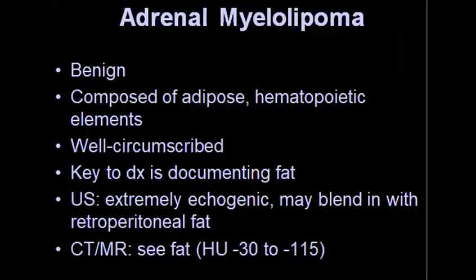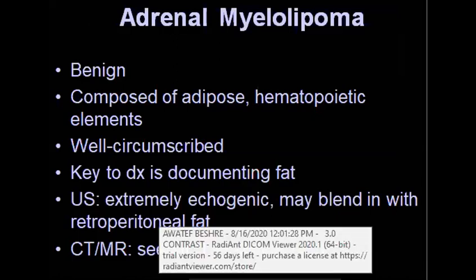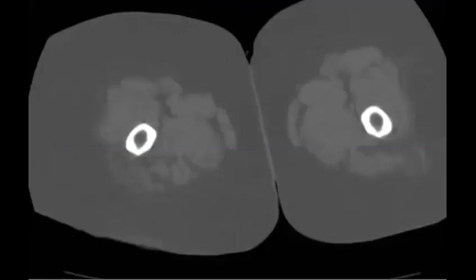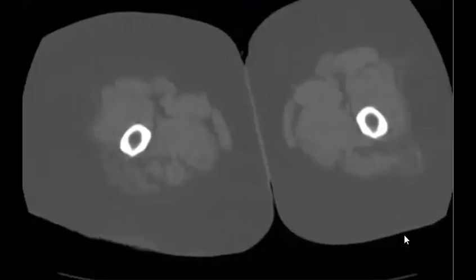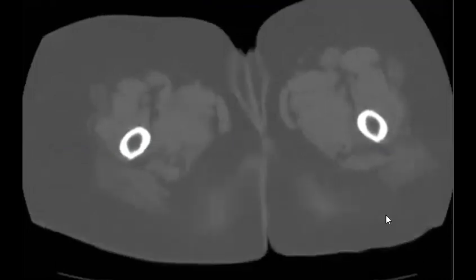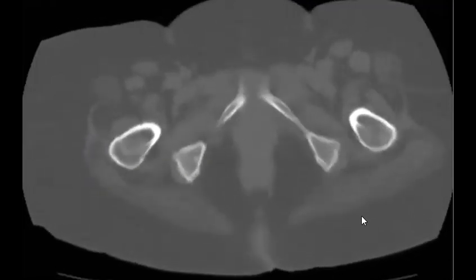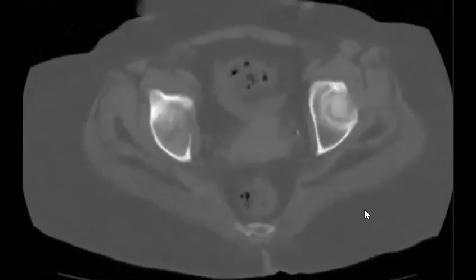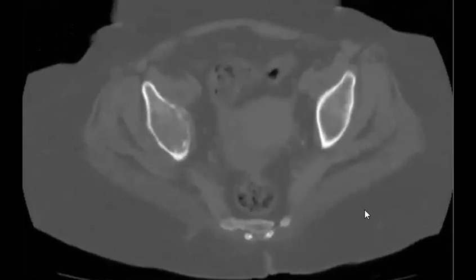I want to show you something. I think it will be a bit of a discussion, but let's see. Now we just make a warning. Let's go to this case, and I hope everyone will enjoy it. So when you find any abnormality, just mention it, okay? And try to describe it.